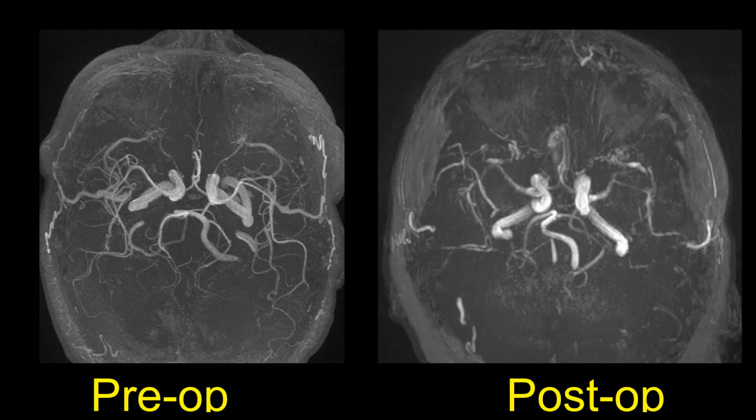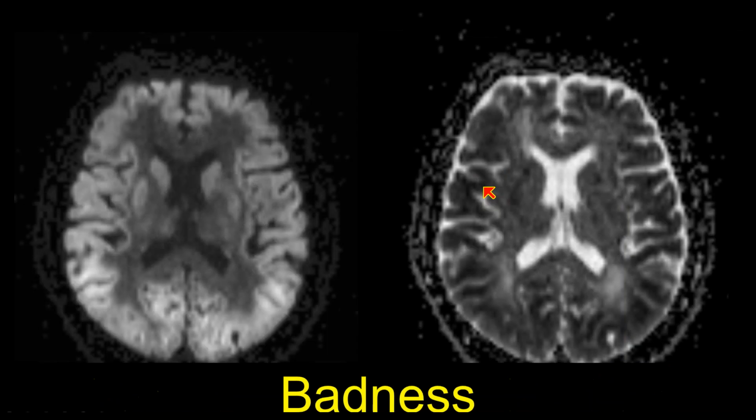Unfortunately, in this patient, they had a bad reaction to the intraoperative anesthesia and ended up having extreme vasospasm. So you see the big difference on this patient's collapsed view MRA, where all of the blood vessels seem to be constricted, and we had some diffuse ischemia in this patient. So we ended up having a bad outcome on the surgery that may have actually been unindicated. It's much more likely that their EAC pain was coming from their condylar head degenerative changes and their TMJ. So that's important to get more clinical information.